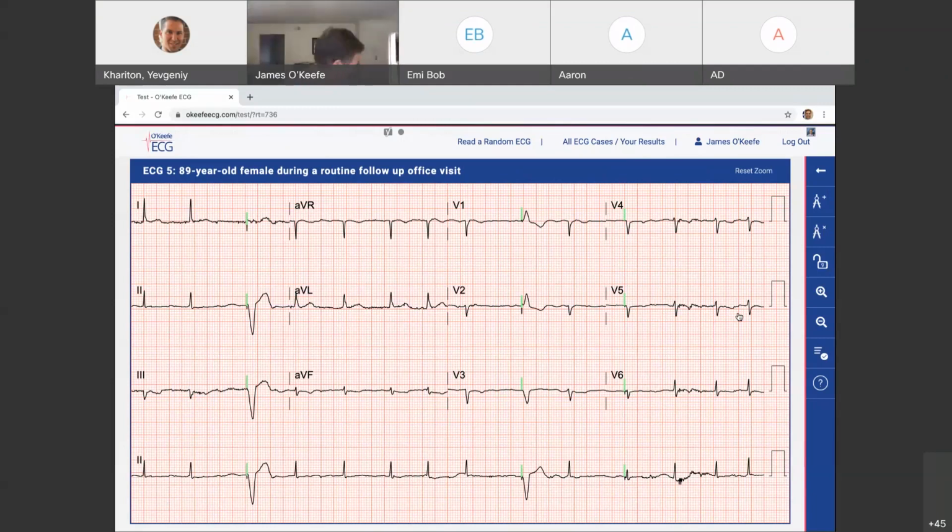I am Bob from Montefiore. I think this is atrial fibrillation with PVCs. Atrial fibrillation, otherwise normal axis. No, I can't tell if these are PVCs or if they are pacing spikes on the line. Yeah, there are pacing spikes there, so they're not PVCs, right?